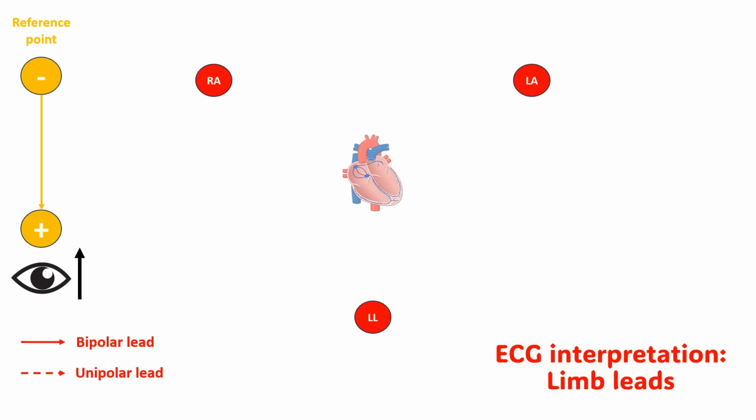Okay, guys. So what I want you to remember is that because this is a 12-lead ECG, we have 12 different views of the heart, despite having 10 electrodes. Okay, so we're going to talk about the views which the limb leads provide first, and the limb leads view the heart in a vertical plane. So let's just go over to this diagram first.